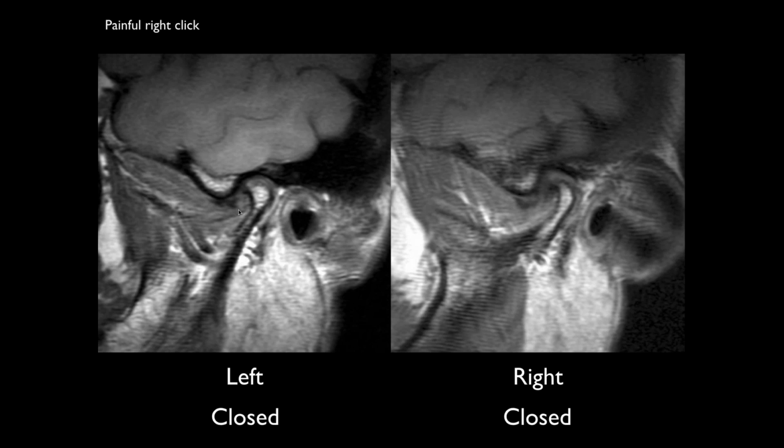Pterygoid muscle, or I don't know which muscle that would be. It's the same. Well, that's the disc there. Yeah, that's the disc. Oh, it's not articulating with the disc at all. Okay, so in this case, on both sides, the disc is anteriorly displaced.